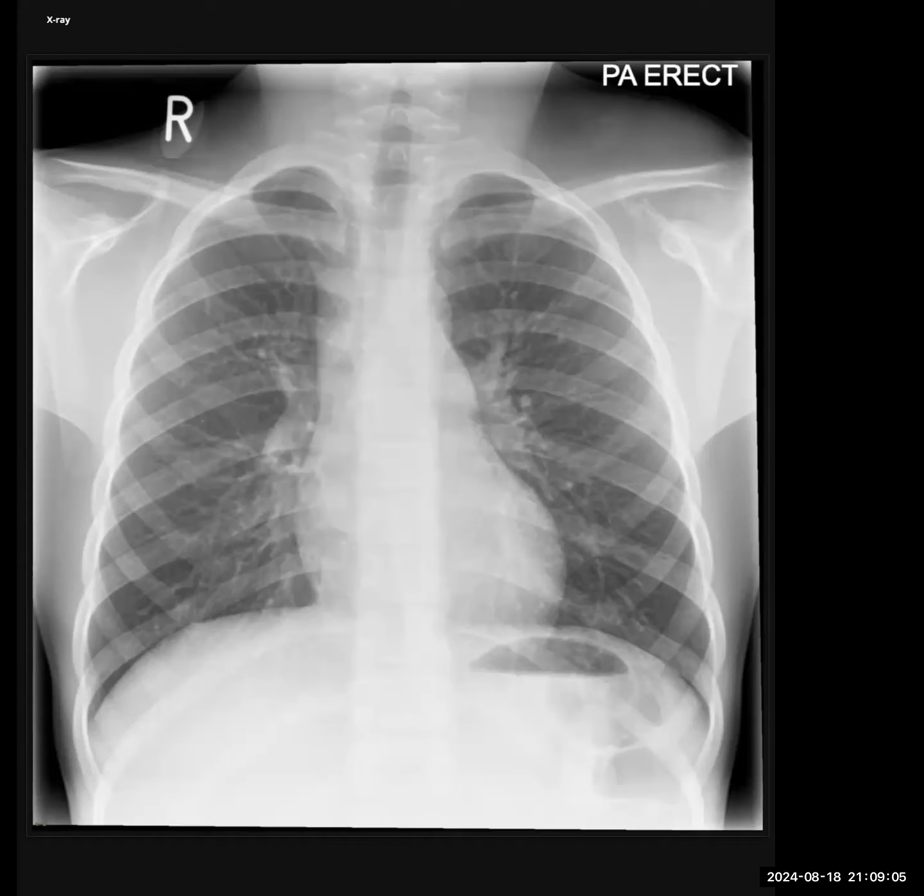I'm trying to look at the clavicle. The clavicle appears normal. I don't see any obvious involvement of the humerus in the post-operative images as well. So I'm suspecting this is an aggressive lesion. In this patient, I would be thinking in terms of osteosarcoma or Ewing sarcoma.